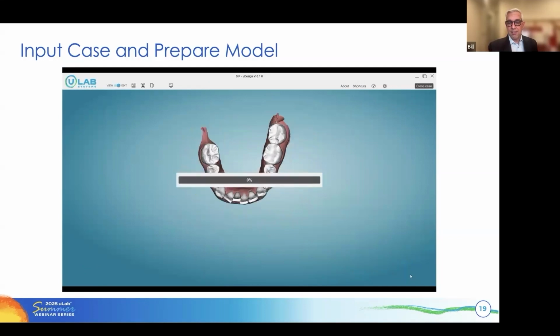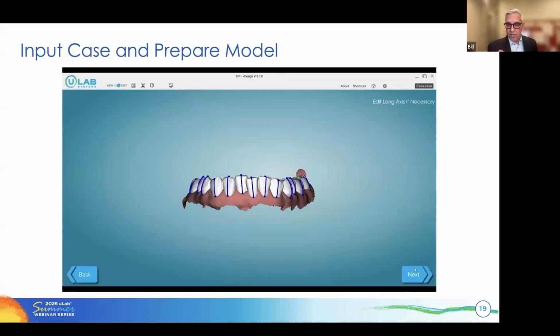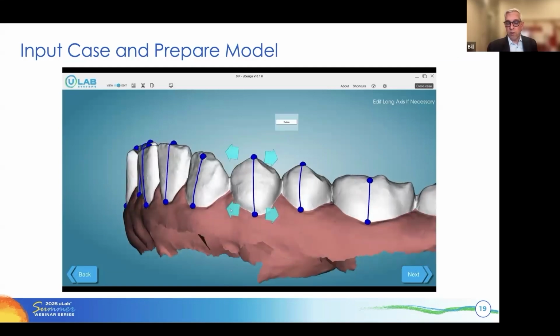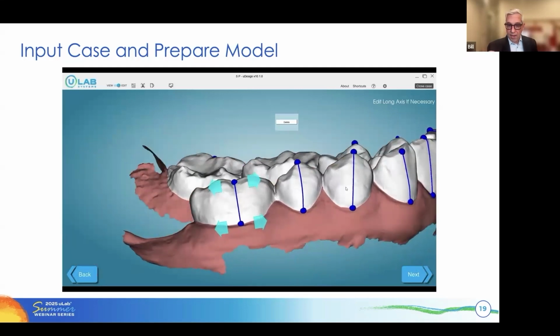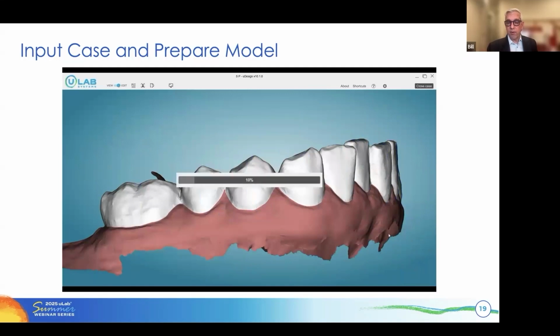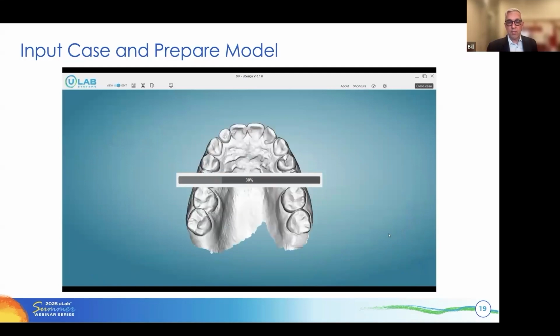So please pause at that moment where you label the teeth and ensure, just a quick check, takes 2 seconds, that you've got those teeth numbered, because the number on that tooth, lower left 3, lower right 5, lower left 6, whatever one it is, determines which bracket is going to go on that tooth. So if they're off a little bit, which happens rarely, now you've got a bracket on the wrong tooth and you have to go in and mess around with it.